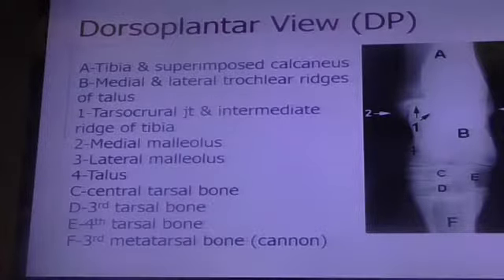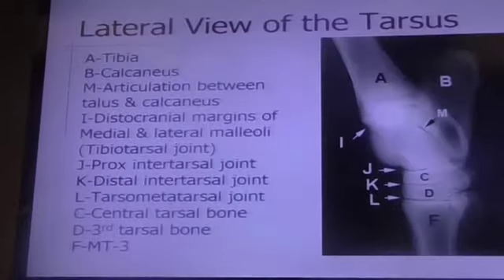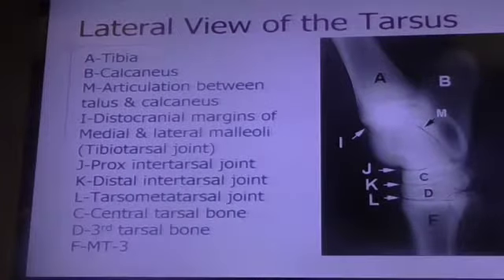And the other structures are pretty much the same. So you can take time, and this is just a review. Okay, that's how they're taken. A lateral view, on a really nice, well-positioned lateral view, you should be able to at least see the joint open, the joint spaces opened, in other words, where you can visualize them. If you don't, then that's an oblique view.